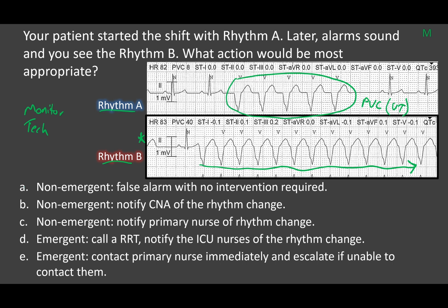Well, it's not a false alarm. You wouldn't have a CNA go look at this patient. This is something that the primary nurse definitely needs to get in there. That being said, we won't say that this is non-emergent, but you have to decide, is this something that is worth calling an RRT, having the ICU nurses know first, and then calling that primary nurse, or do you just have the primary nurse handle it?